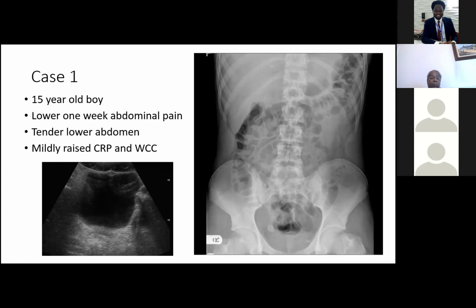It could be a foreign body as well. Okay. Yes, certainly at the time when this examination was performed, this opacity was noted. It's a bit laminated. You can see it's got concentric rings, and it's in the right hemipelvis. So the thinking then was, could this represent a calculus, vesicoureteric junction, bladder? The other possibility was an appendicolith. But initially, I think the thinking was more likely this might be a calculus in the urinary tract.